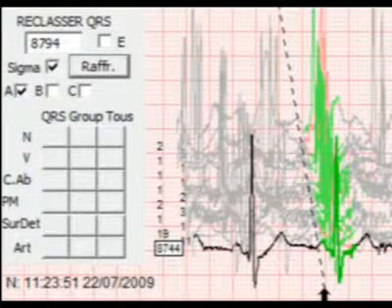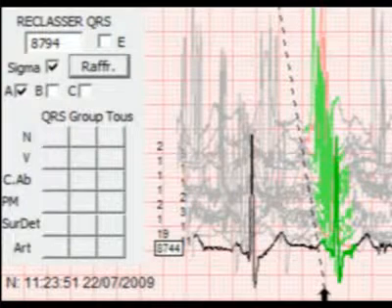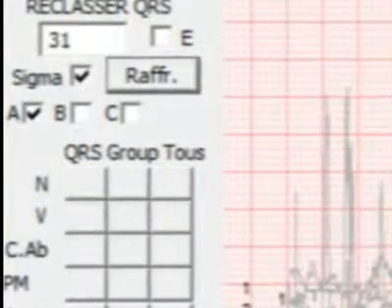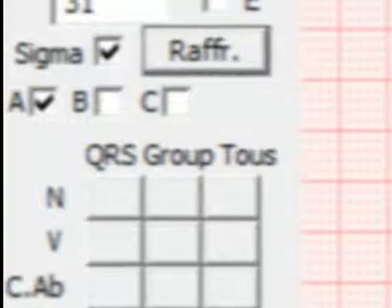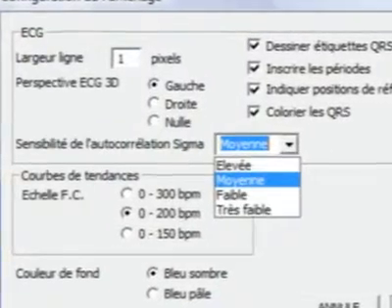On the other hand, in this mode, the program behavior is significantly different. Therefore, it is advisable to use it only in special cases. The resemblance of the QRS is studied on the selected tracks. Automatically, the existing tracks are selected, but it may be useful to discard an artifacted track, which prevents the QRS from relating and makes this mode unusable.